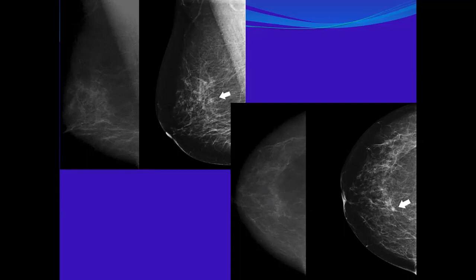We said the only asymmetry we have to consider of reasonable or moderate suspicion is the evolving one, the developing asymmetry. So what is the risk of developing asymmetry?